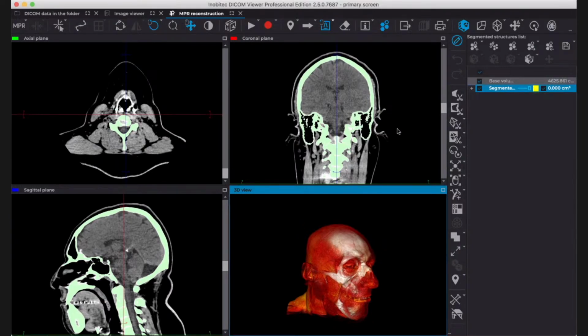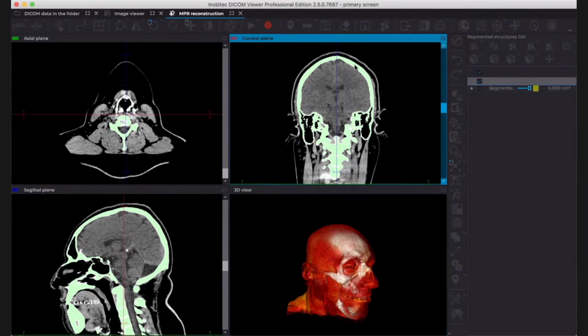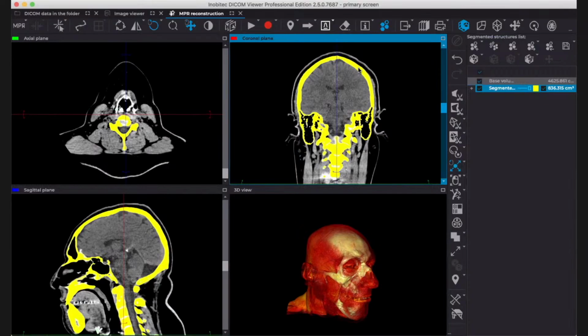From this mask, we are gonna use this little tool here, which is segmentation from point by mask. Okay, I'm gonna select the tool with my right click. And now, if I click over my mask on a point, every pixel that is connected to that pixel will be selected to be part of my 3D model.